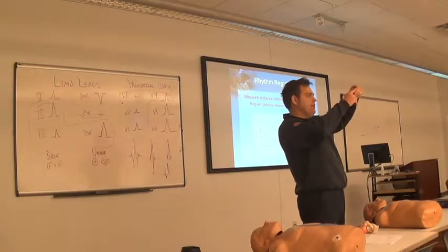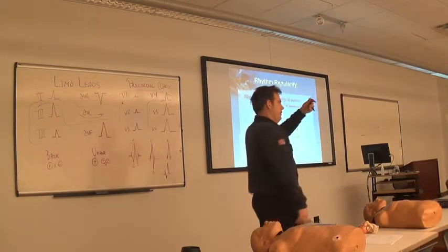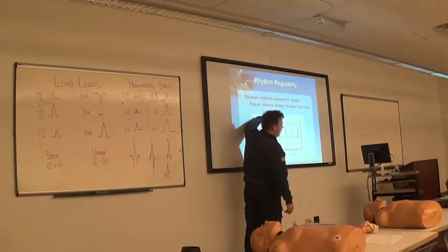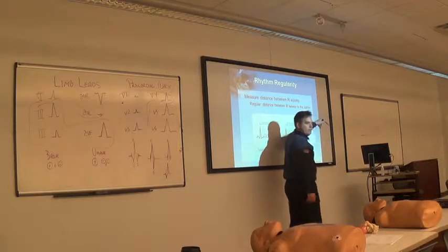What it does is you can make them wider or narrower. It's a graphing tool. So what you're going to do is put it on each R wave. I can't make this big enough, but you're going to hit these two R waves, and then walk it. It should be the same distance between each R wave.